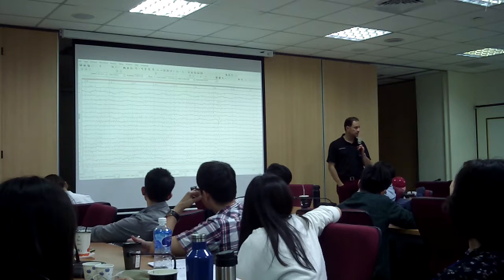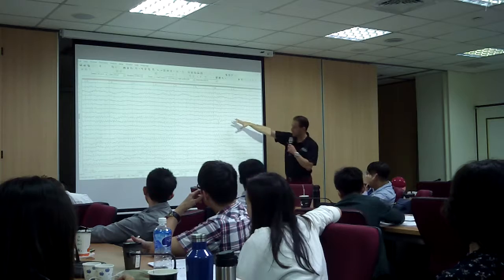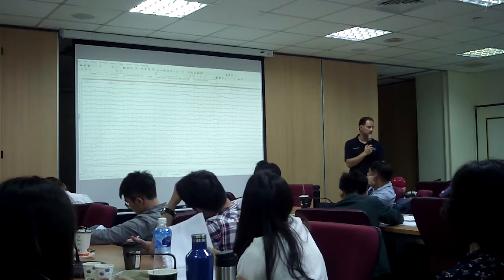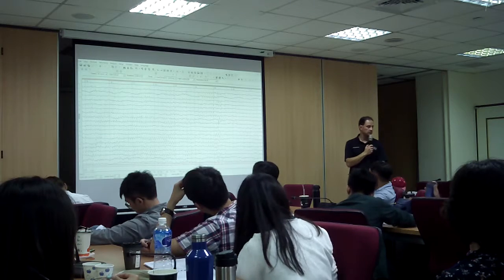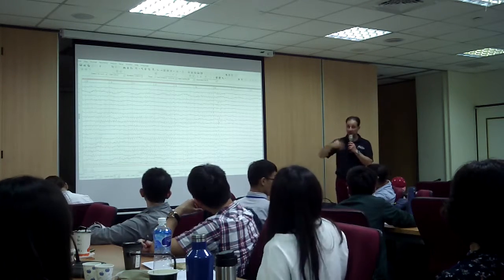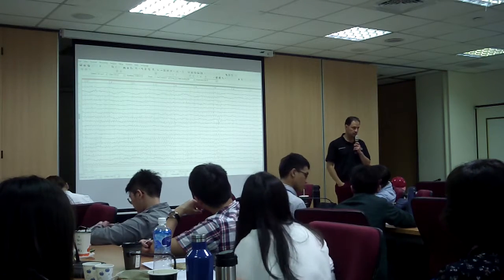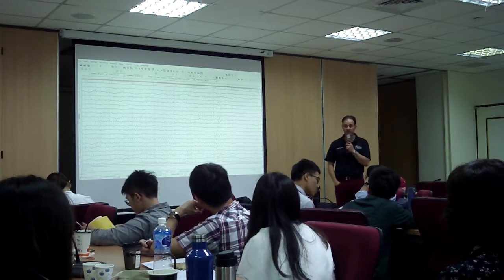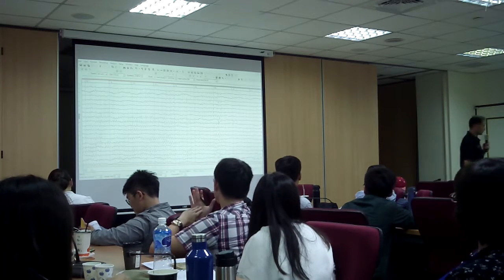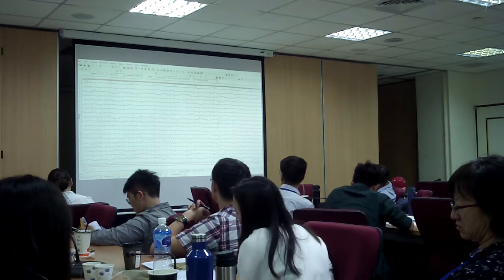He's spacing out. And the Broca area thing that you were saying, you were right on. He has a tip of the tongue phenomenon. It is the slowing. And we have trauma, physical trauma and emotional trauma, because he just lost his wife of 50 years. So that's very significant. Now let's look at the EEG analysis, the spectra, and you will tell me where you're going to train and why.